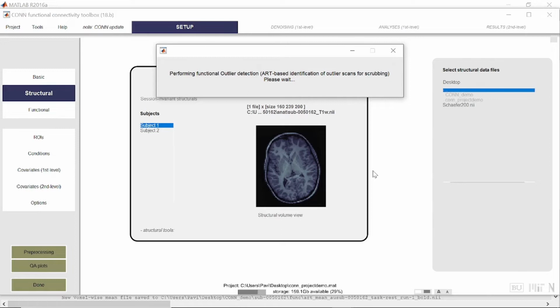15 minutes is on my laptop that I'm using. If you have powerful machines, the process could be fastened up, since CONN toolbox allows for processing all of these steps in multiple threads, meaning parallel computing. Now let us wait for CONN to finish all of the pre-processing steps.